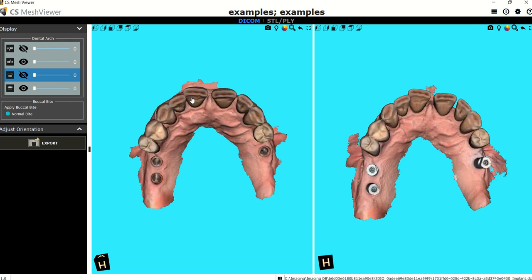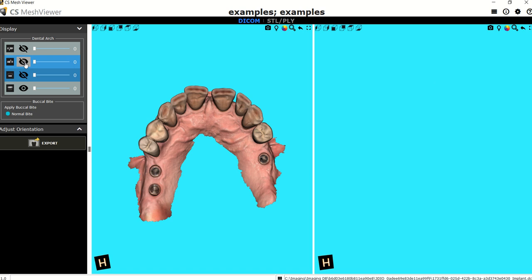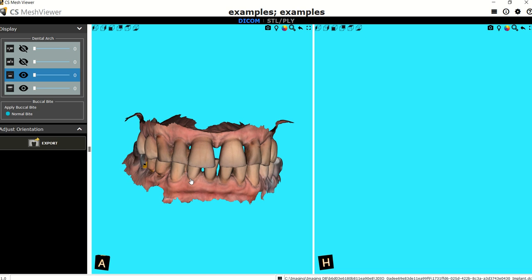And obviously you do not need to scan a full arch a second time. These are just stitched in, hence the cutting and rescanning of the scan body stage in the implants. However, if you incorrectly save your scan as an orthodontic scan when you're saving and exporting, then the only thing the labs will receive is that scan in occlusion, okay? So that's all they'll receive. They won't see the scan bodies.